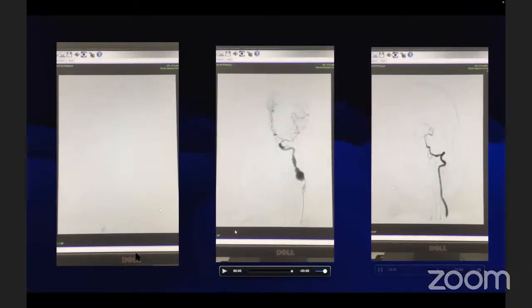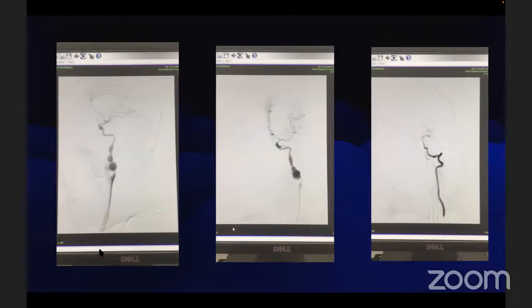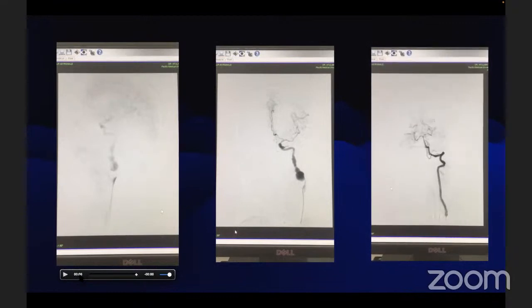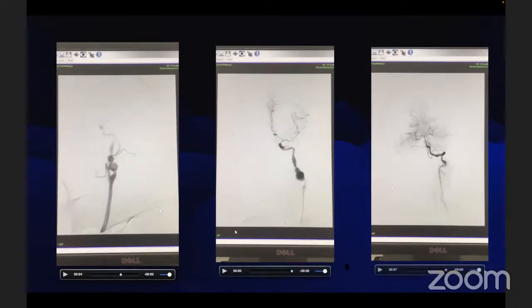Both sides are definitely deformed arteries from the origin of ICA. Can you stop there? There is no deformity in the common carotid artery, and the carotid bulb is also looking normal. Beyond that only are the changes in this particular case. Bilateral ICA deformation, or dysplastic artery with constriction and dilation and pseudoaneurysm formation on the left side, and the right side having two ICAs, whether it is a dissection or a duplication.